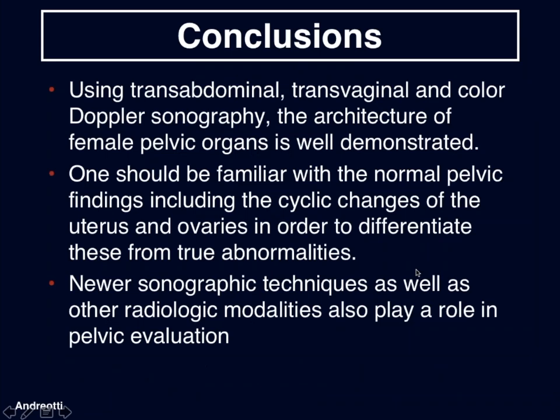So in conclusion, using transabdominal, transvaginal, and color Doppler sonography, the architecture of the female pelvic organs is well demonstrated. One should be familiar with the normal pelvic findings, including the cyclic changes of the uterus and ovaries, in order to differentiate these from true abnormalities. And newer sonographic techniques like sonohysterography and 3D of the pelvis, as well as other radiologic modalities, can also play a role in pelvic evaluation.